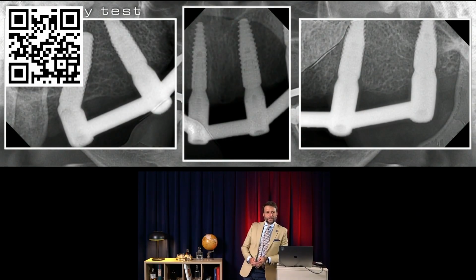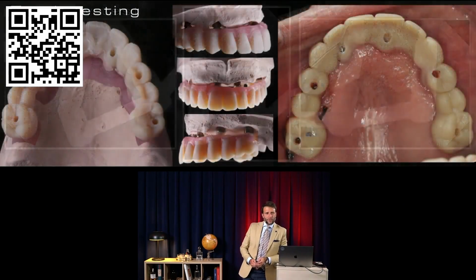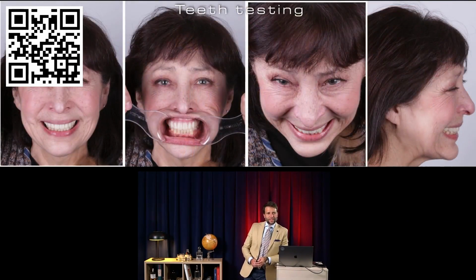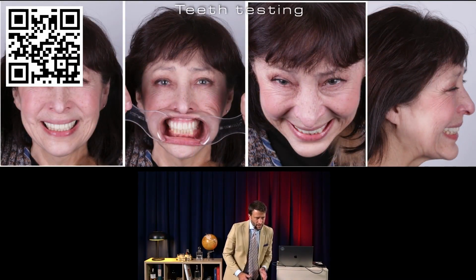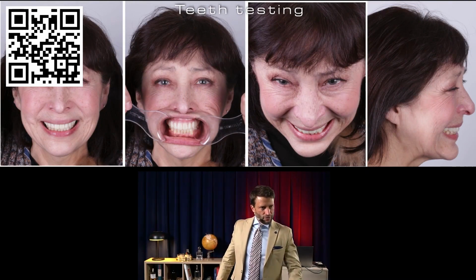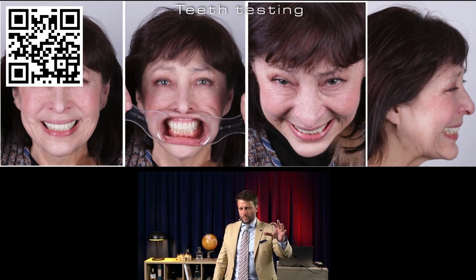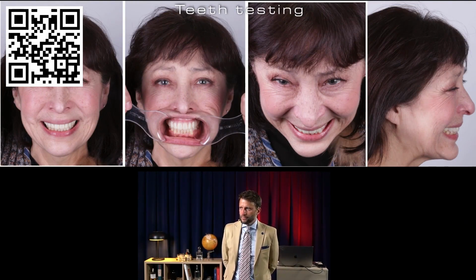So the doctor is completely confident, so we can go ahead and we can mill, and this is the prototype, the test drive, the printed prototype to test. This is very useful, okay? I strongly suggest you to also always test a printed prototype on these big cases.